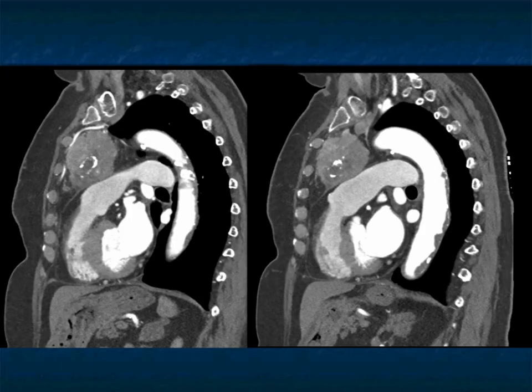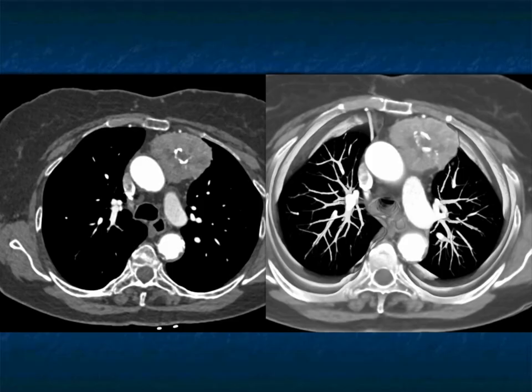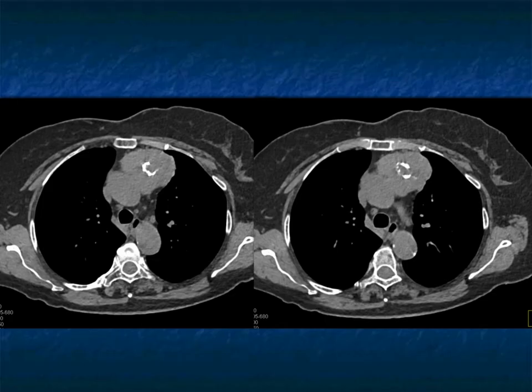And again, looking at the prior case, the eccentric nature of the mass, again, calcification, thymoma would be right up there. So surely you would have been right saying it's a thymic tumor. I worry about malignancy, but this was a thymic carcinoma. Just a very, very nice example. And again, the calcifications may be a bit more common in thymic carcinomas, but they're not that common in those lesions either. And here it is on the 3D mapping with volume rendering as well.